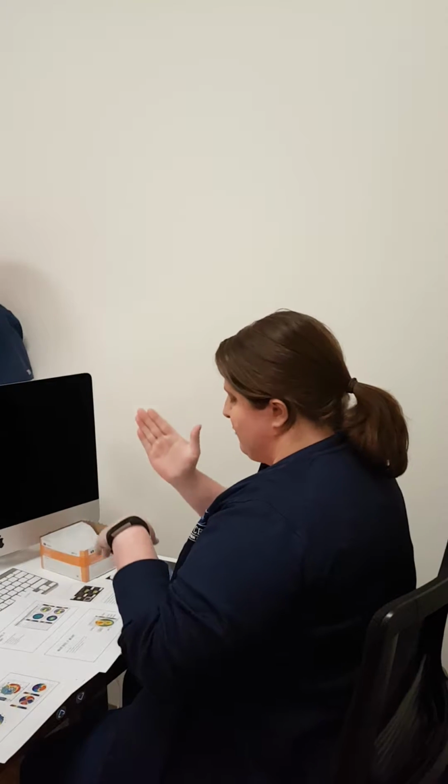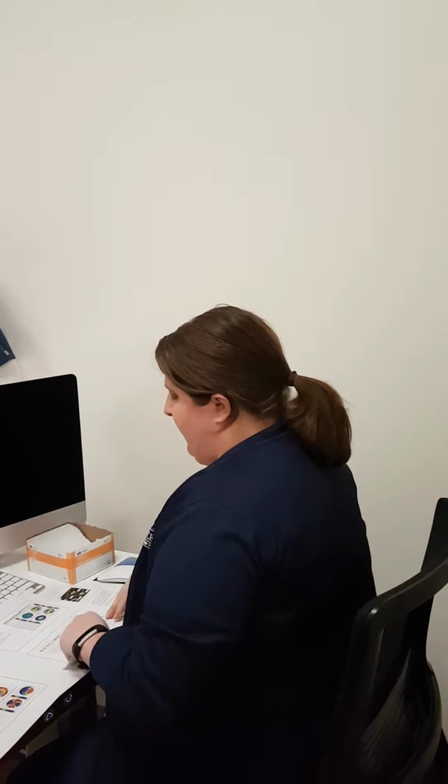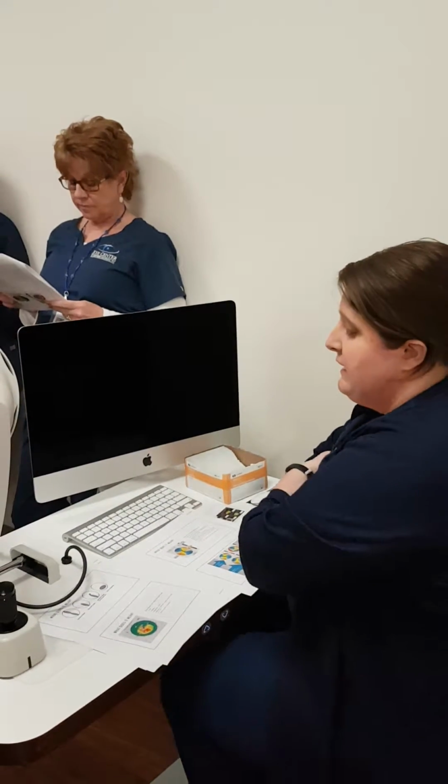Some things that we pay attention to, superior and inferior keratometry measurements should be about equal if you have a regular astigmatism. And then also the axes, so the little red and blue lines, should line up with each other. If you see a bunch of broken ones, some red ones over here, blue ones over there, that's an irregular cornea, okay? On the next page, you will see some examples of the different type of patterns that you can see.